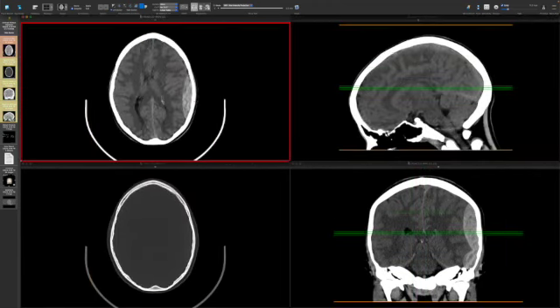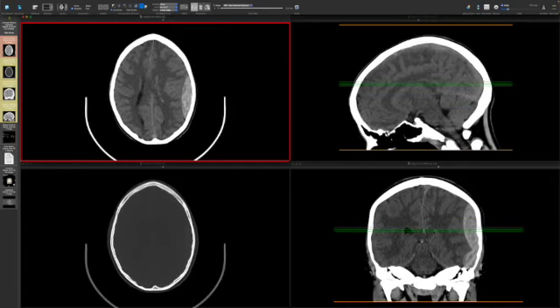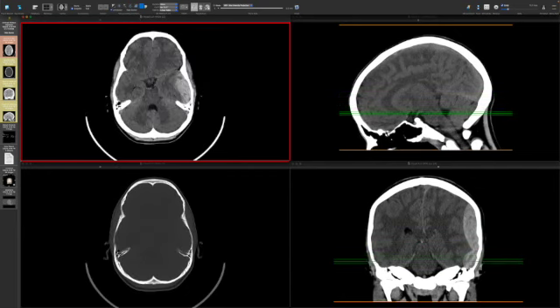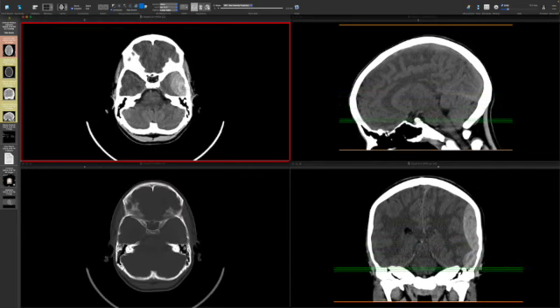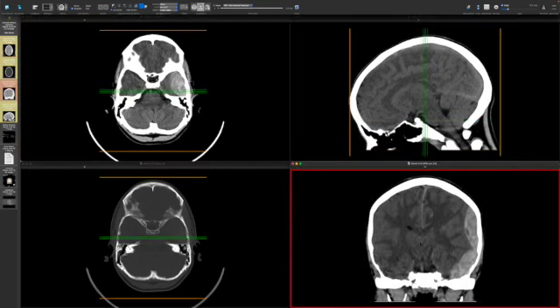The primary finding in this case is a hyperdense, biconvex, extraaxial collection that's overlying the left frontal and parietal convexity. And there's also a second area, which is down here overlying the left temporal lobe. You can see that really nicely, how this is a bilobed, biconvex, extraaxial collection on these coronal images. You've got one hump here and one hump here.